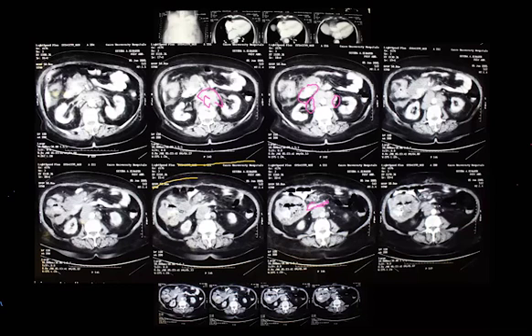What else could it be? Inflammatory. I would be very cautious designating or diagnosing para-aortic lymph nodes as inflammatory. I'd be cautious, possibly, but unlikely. Okay, a testicular tumor, yes. Pradeep is saying it could be a testicular tumor, which you've already said because you're talking about a primary metastasizing into para-aortics. Yes, absolutely. Which means that these are the areas that you should be looking for.